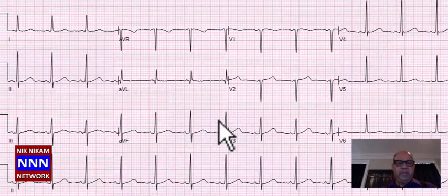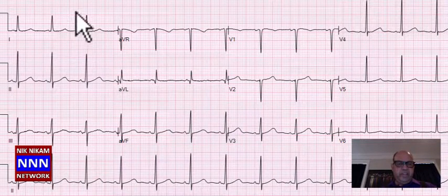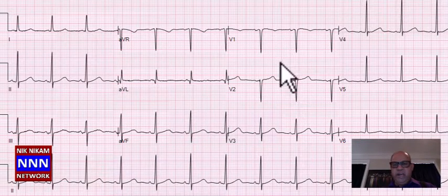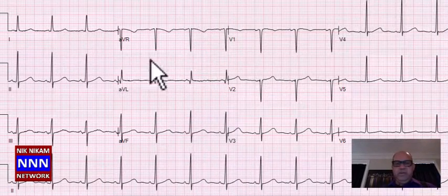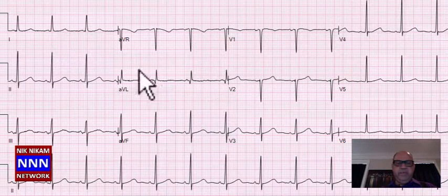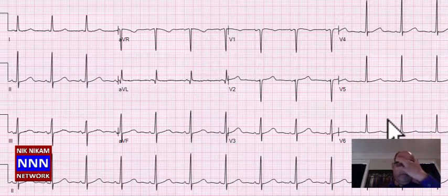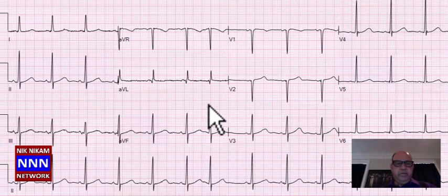Your mind should be going at 100 miles or maybe perhaps 1,000 miles per hour when you look at these electrocardiograms. Sinus rhythm, high anterior, little flat T waves, inferior leads look okay, anterior leads poor R wave progression. This may be just related to lead placement. There are some non-specific T wave changes. That's what I would recommend. So we have basically a sinus rhythm with lack of R wave progression in lead V1 and V2 with non-specific T wave changes. All right, moving right along.